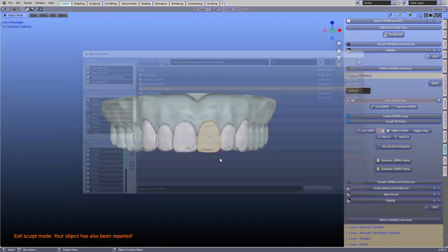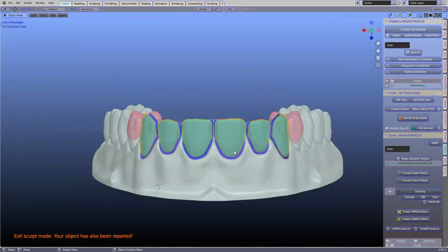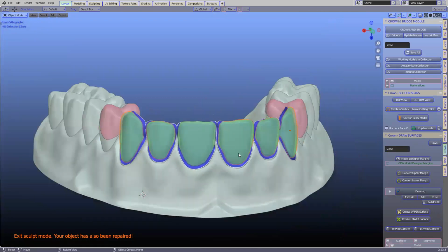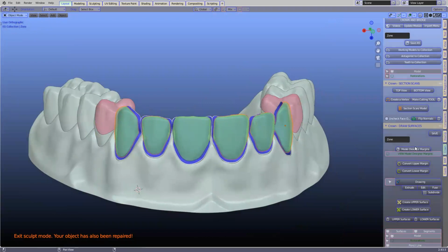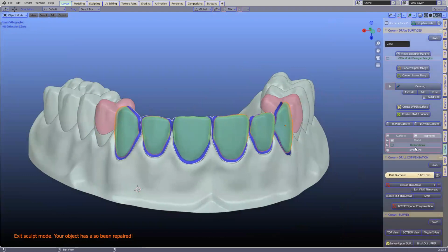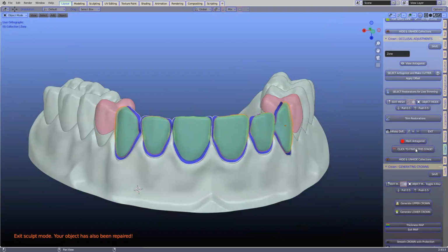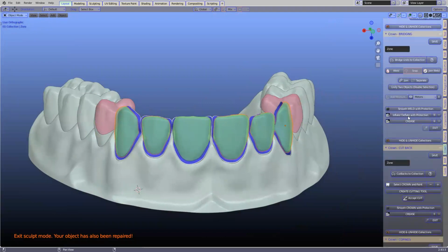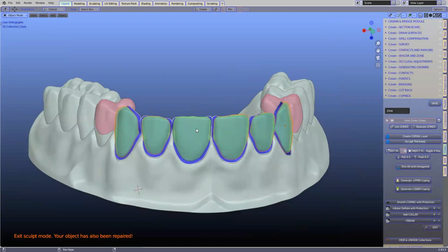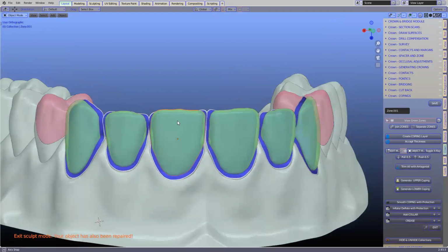spacer zone. Okay, so here I was saying that this is sort of the halfway mark. We wouldn't do this probably because it's super thin. I don't even know if you could mill such a thin structure. But if we wanted to go to the copings, the coping is a thin layer. So let's just go to the copings here. The green layer is the starting point to make copings.